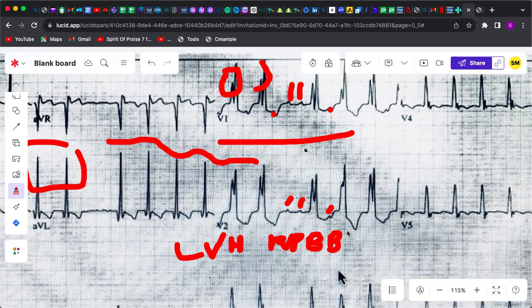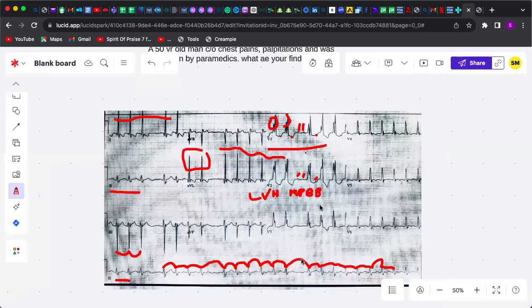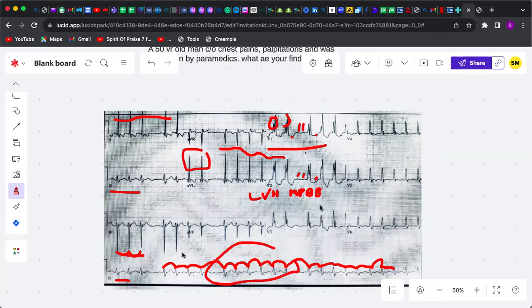So whenever you're having regular RR intervals plus some irregularities in the RR intervals, so to say, some kind of patches here and there, like we're seeing here, you can have a regular one, then it becomes irregular and stuff like that.